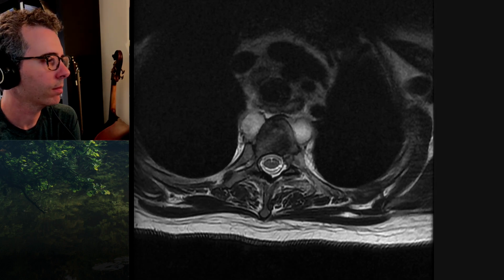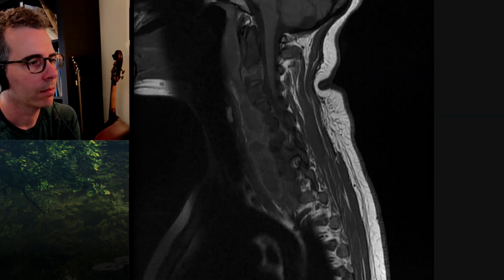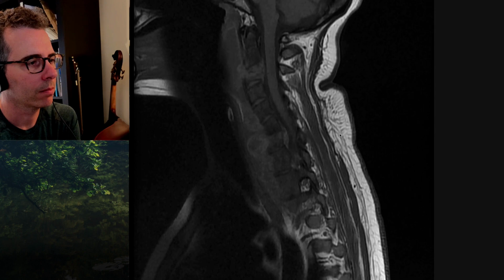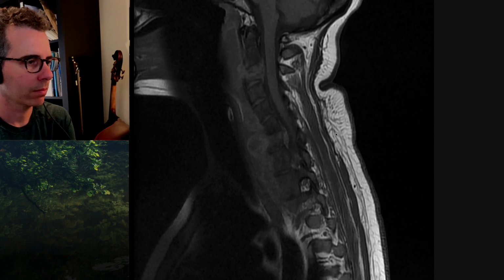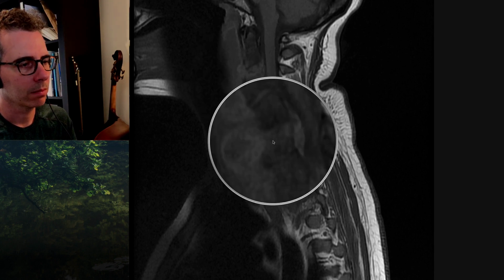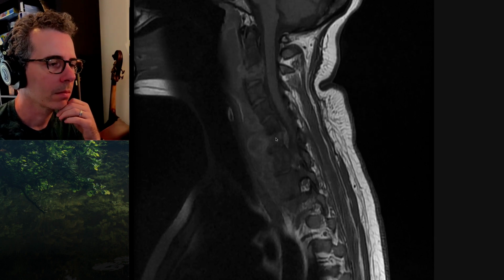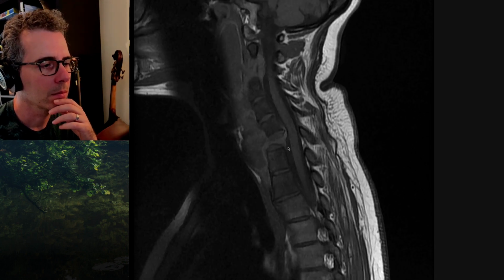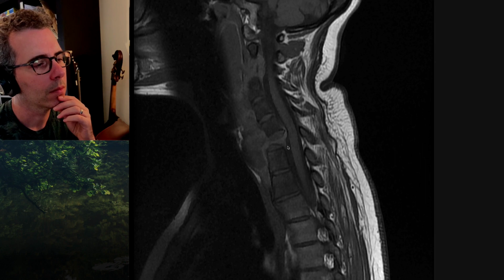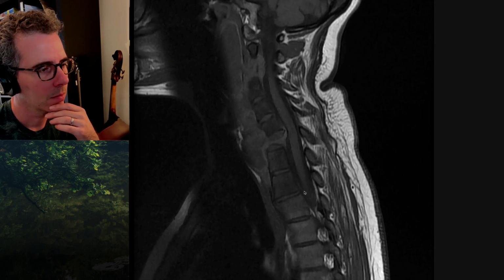I'm just looking at the bones now. So on T1, there's significant bony destruction, particularly involving C3, 4, 5, 6, 7. The vertebral body is deformed with anterior wedging, and there's kyphotic deformity at this level at C6, C7. Similar changes are also seen at C3.